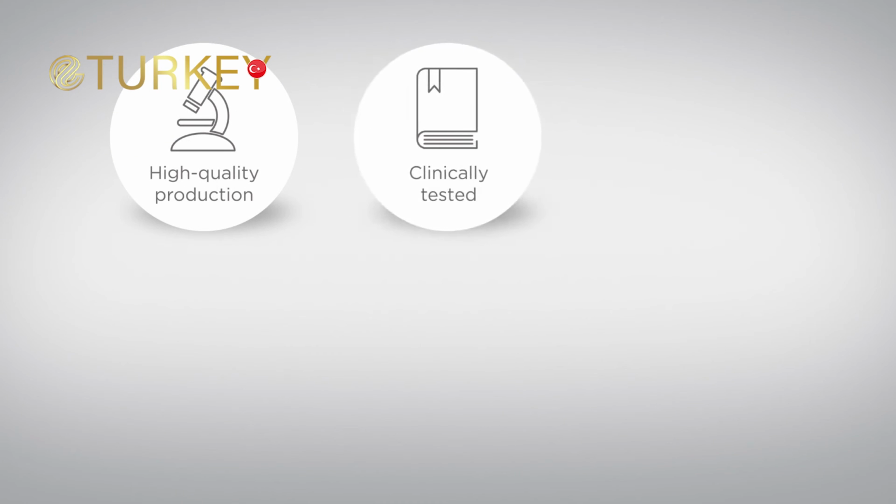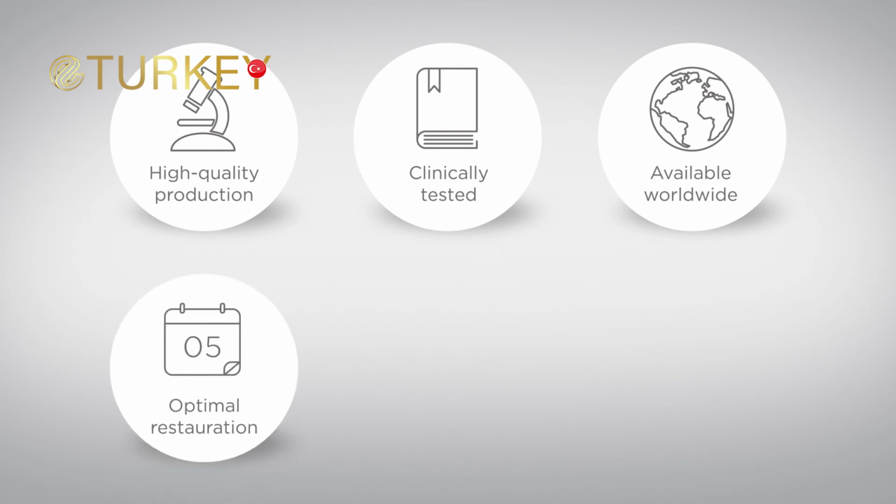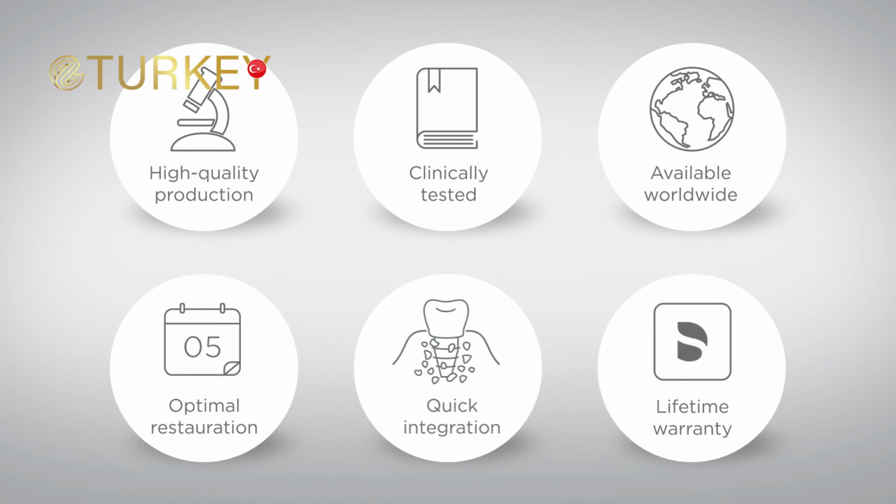Implants from Dentsply Sirona are high-quality medical products that are clinically tested and available worldwide. Replacement materials are available even after decades. Dentsply Sirona offers a lifetime implant and abutment warranty. Please ask your dentist for more details.